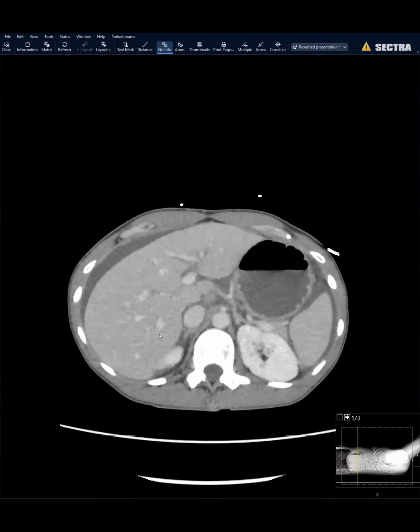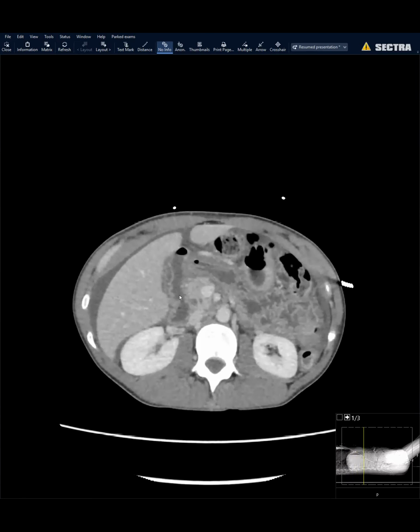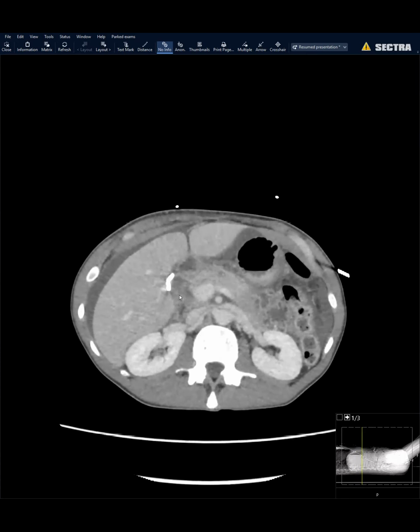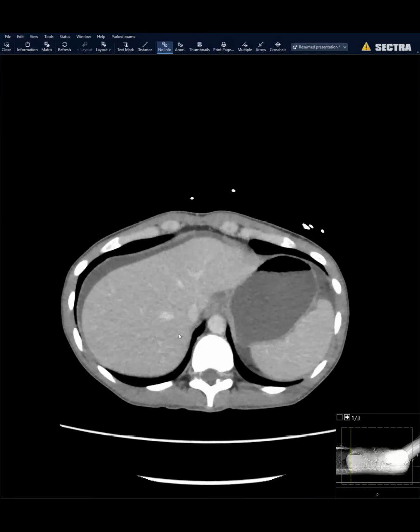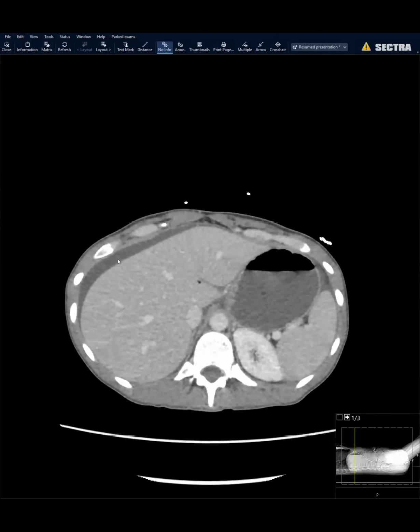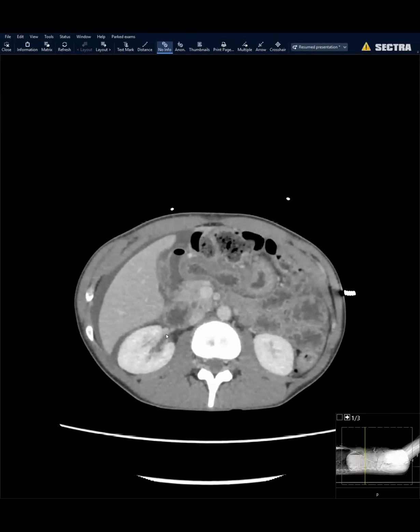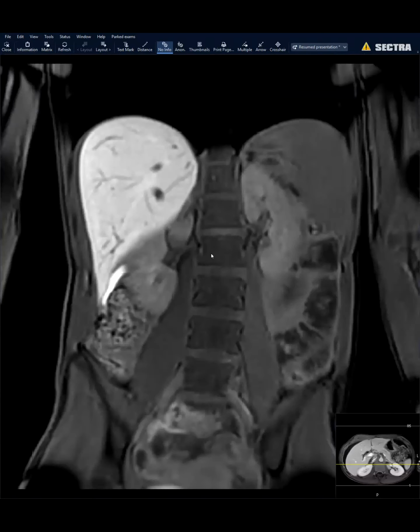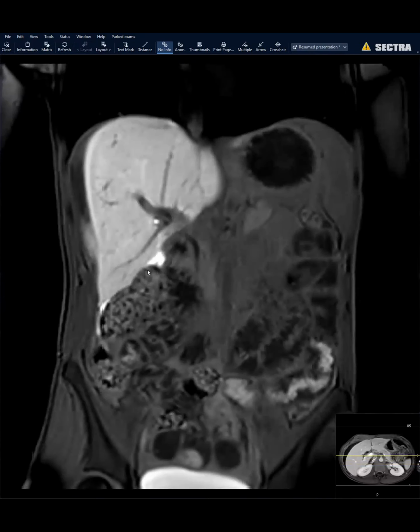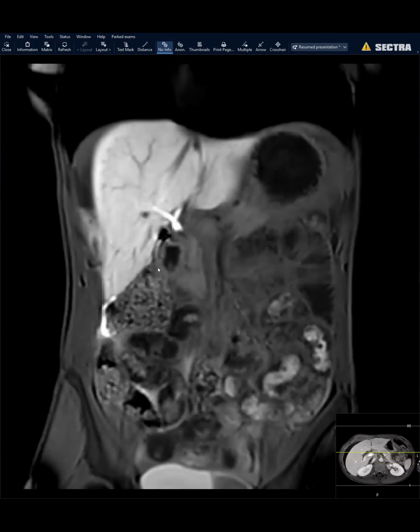So we saw a little bit of ascites. There was nothing in the cholecystectomy bed as such. But we still said, just being a week out, it's not unusual to have a little post-operative ascites. We still said, do check the ascitic fluid to see if it's bile or do an Eovist scan. And then they did both. And it's just a nice example to show how Eovist actually helps us. So this was actually a bile leak, which declared itself really nicely on the 20-minute Eovist images.